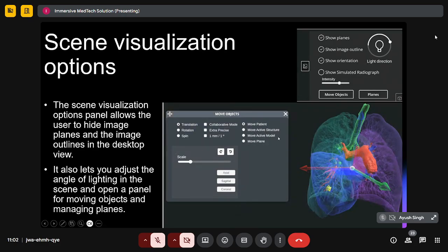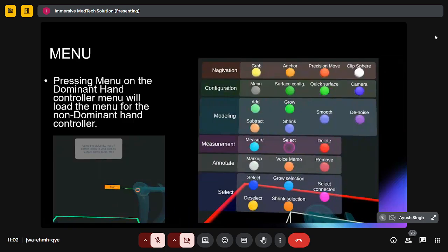A structure is a sub-part of a model. The model may contain various different structures, like the trachea, then for the heart we have the aorta, or the lungs. These are the different structures carried in a model of the particular soft tissue. Then we can also create a new model for hard tissues like the bone and other orthopedic parts, and furthermore the labeling can be done. Labeling can also be done at the final stage.